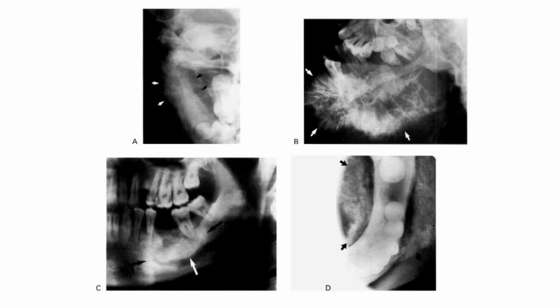The osteolytic ones have no neoplastic bone formation, whereas osteosclerotic, you guessed it, have neoplastic osteoid and bone formation. In early formation, osteosarcomas show non-specific, poorly defined radiolucent areas around one or more teeth, and widening of the periodontal ligament space can happen.